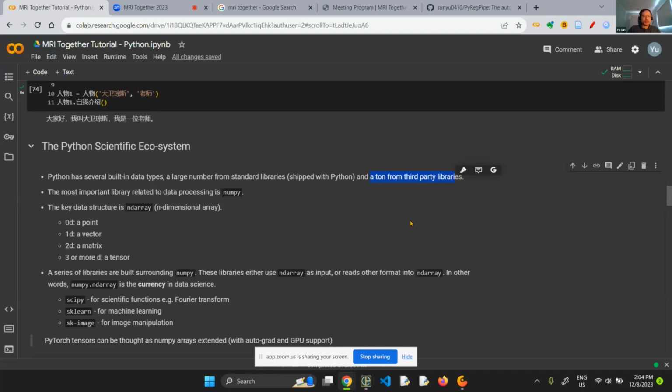With 3 or more dimensions, in some languages we call it a multi-dimensional matrix, or in a general sense, a tensor. Like in TensorFlow or in PyTorch for deep learning, we call it a tensor. So all these ideas are quite similar, and NumPy is probably the first library out there that offers the capability to handle n-dimensional, any dimensional actually. So n can be very large.